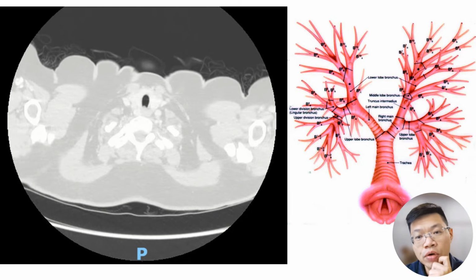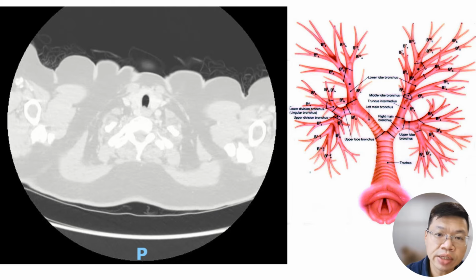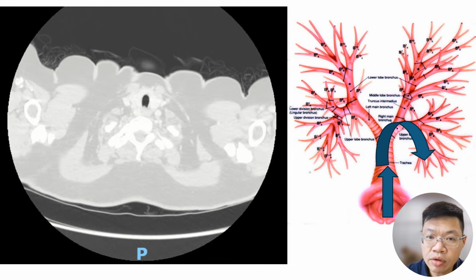Recalling the movement of our bronchoscope, as we enter from the main carina, what we have to do is to proceed with our bronchoscope, turn right, and move cranially to enter the right upper lobe. This means that to correlate to the CT image, the best reconstruction would be the axial CT. And because the bronchoscope makes a turn to the right, the CT image will need to turn to the left in order to match the bronchoscopic orientation.